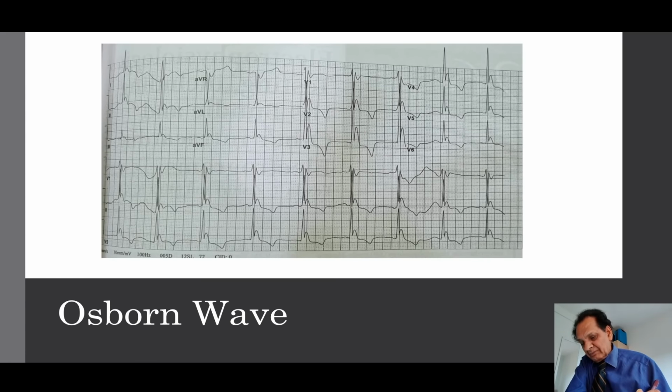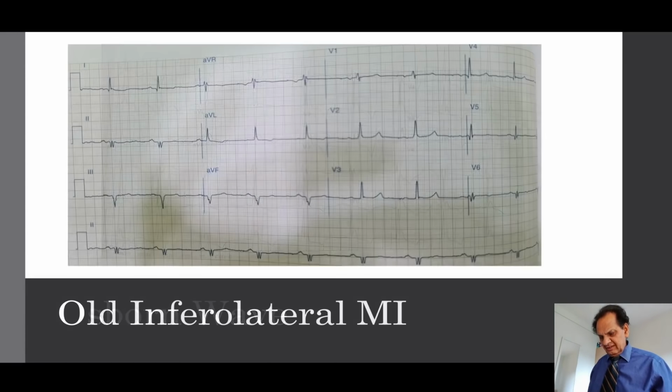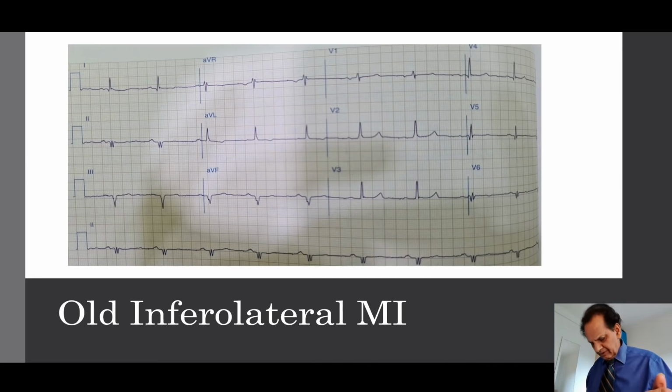Again a hypothermic patient. There was a snowstorm, and after that the patient landed in ICCU with these waves, Osborne waves. These are the J type of waves. If you see them once, you never forget in your life. Osborne wave. It's important to take a rectal temperature in septicemias or therapeutic hypothermias. The patient may land into troubles, a standstill, if you don't take care of this. So rectal temperatures are important.